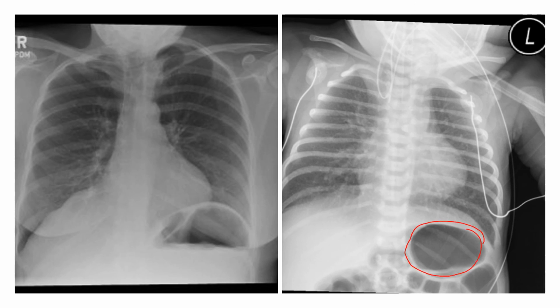This is a neonate x-ray, right? You can sort of see a little bit of the differences. You see how much space there is in between their bones and all this other stuff. Right, so these little guys, their chest is already taken up a lot by the heart, as it is, right? Their cardiothoracic ratio, and then now you add a big giant gas bubble in there. What's that going to do to your left lung? Well, that's going to restrict it from expanding, which means are they going to be able to get as much oxygen into their bloodstream if they don't have as much tissue that's expanding, right? So this baby can easily desat and have trouble breathing.